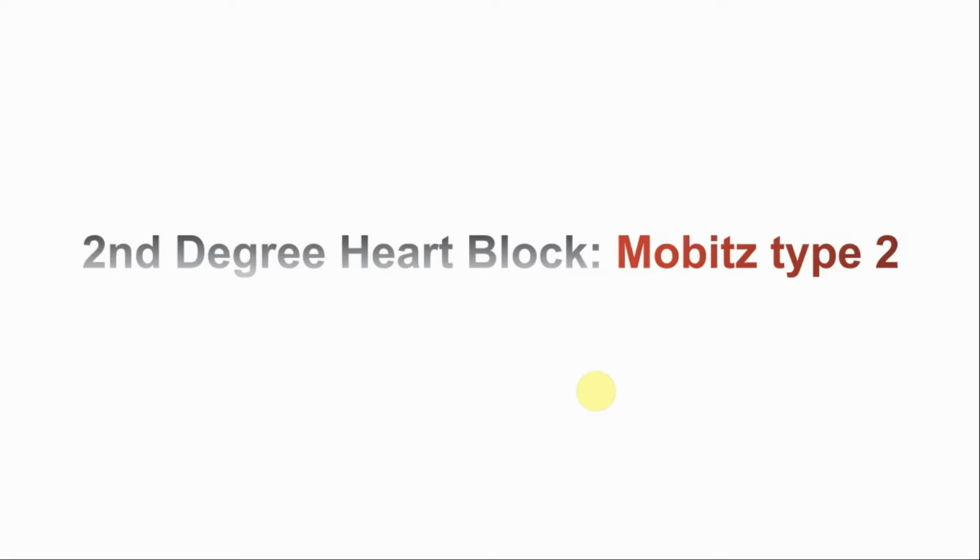It can happen in different ratios. It can happen 1:1, so for every 1 P wave there is a QRS complex. Not 1:1 means usually it happens 2:1, 3:1, 4:1, 5:1, 6:1 block. If it goes beyond 6:1 block, sometimes it can be unpredictable, a high grade block. So let's keep it simplified.